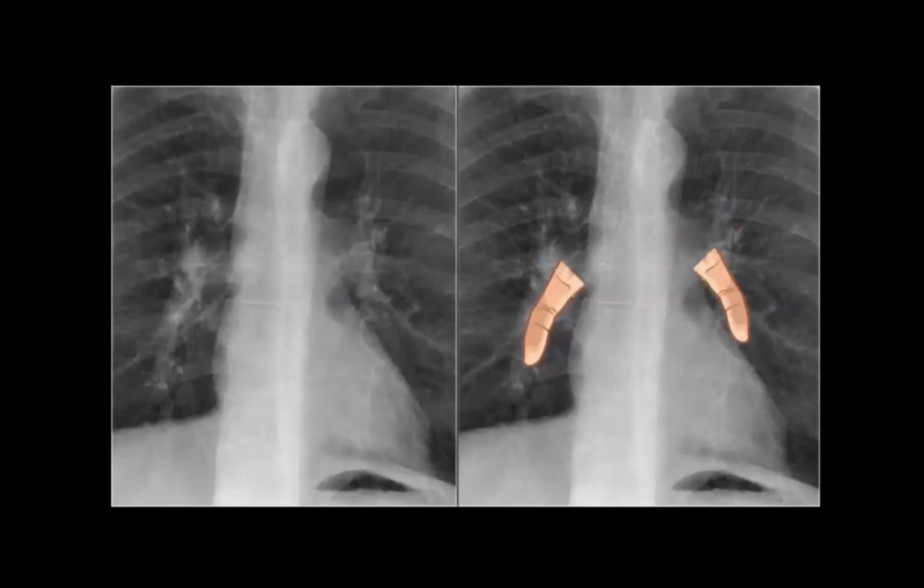And I brought this one because I remember it from Dr. Mahmoud Saidi's lecture, the little fingers in the hilum, and those correspond to the lower lobe or the interlobar vessels, actually. When you look at it, always look at those little fingers, because sometimes they can be silhouetted, they can be displaced, or importantly, they can be enlarged. And the enlargement has differentials. So when we look at it, usually it's actually more common.